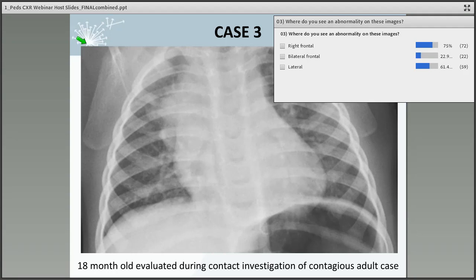All right. So on the frontal chest radiograph, if you follow the cardiac mediastinal contour, so here's the cardiac contour, very smooth. And as you come up, you start to lose that mediastinal contour. And then just lateral to that, you see lumpy, bumpy opacity. Now this opacity could be in the lung, or it could be adenopathy. It's very difficult to delineate that. On the left side, you see some cluster of vessels. Difficult to say if there's anything there. Let's move on to the lateral.